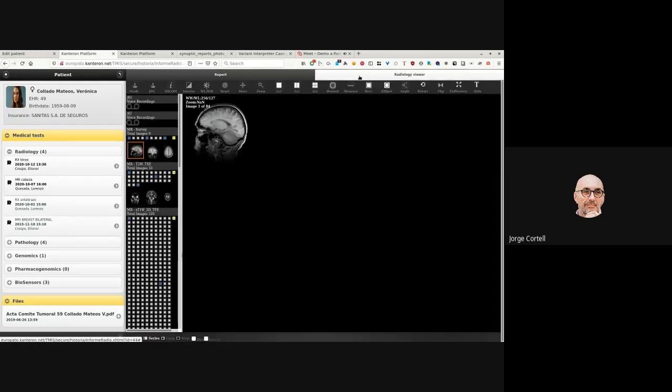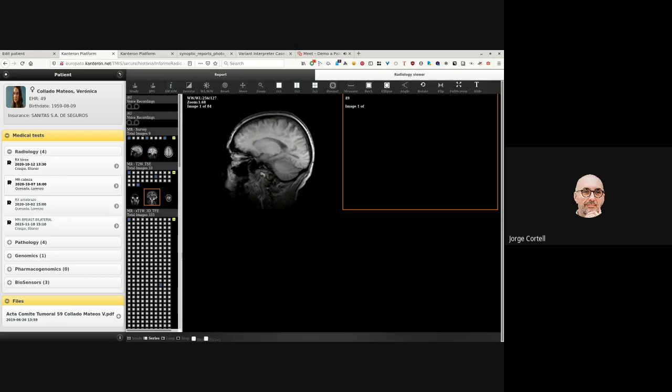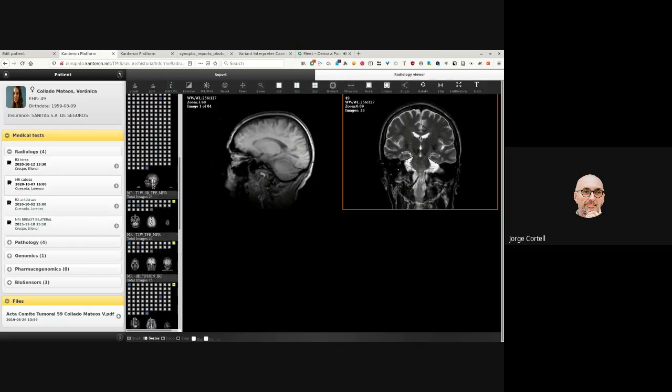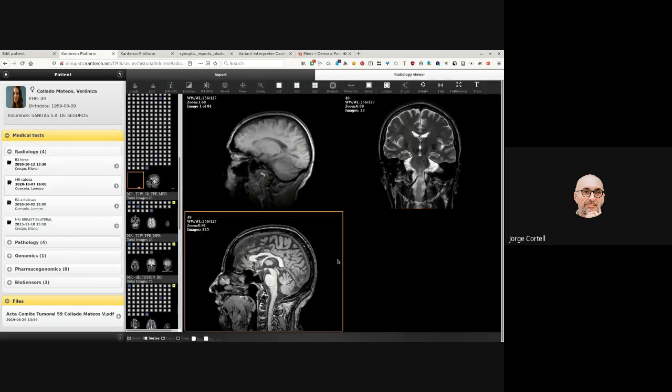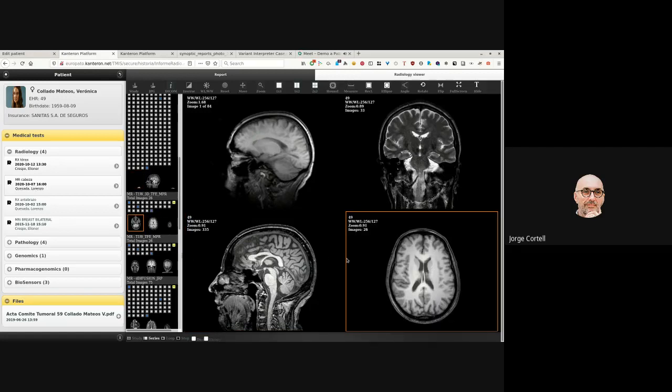Now, the viewer can be anyone's. It can be Agfa's, it can be GE's, it can be Philips. It doesn't matter. This is our viewer, but it could be any other. As a matter of fact, we have other viewers, and if you have time, I can show you the latest viewer. But the point is, we see on the left the studies, and those can be all of the studies for the patient. It can be the studies from the last 4 months or studies marked as, I don't know, oncology.